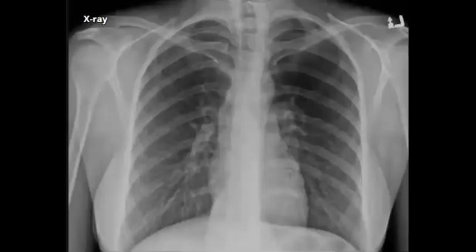Let's try now some quick short cases. I wish it will be easier, inshallah. I hope so. In short cases, maybe it will be just one question or a few questions. Anyway, we take it like a spot short description. So what do you think about this case?